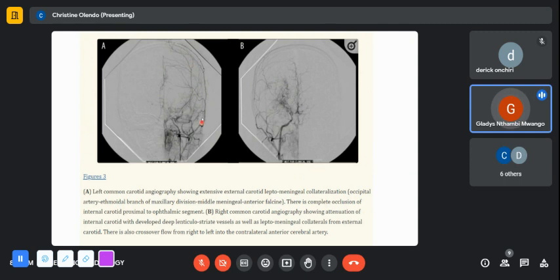Remember, the external carotid gives you blood supply to the meningeal arteries, to the meninges. You can see those vessels from the internal maxillary going up to the meningeal arteries. You can see there are branches going into the brain parenchyma, which is unusual. So it's again just trying to get an alternative source of blood supply.